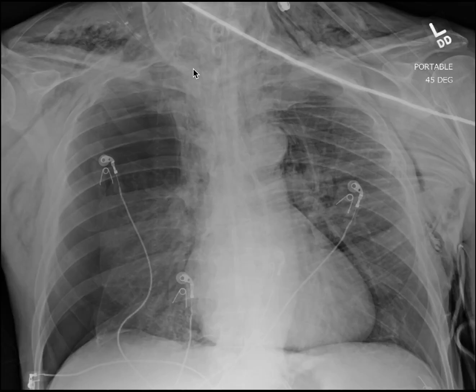Ideally, if you have end-tidal CO2, that would be perfect. Next, to address obstruction, you pass a suction catheter, and that was done here. And it passed. If it doesn't pass, you have your answer. There's an obstruction. But if it does, that implies patency of the tube. Now, in this scenario, both tests were passed. So that leaves us asking, what the hell is going on here? And what do you do next?